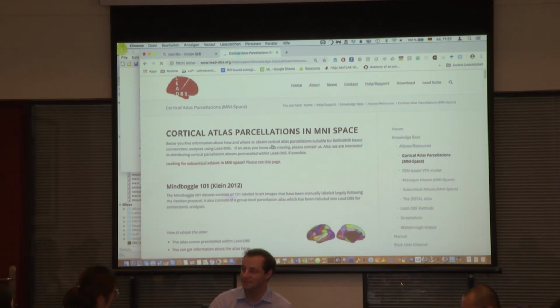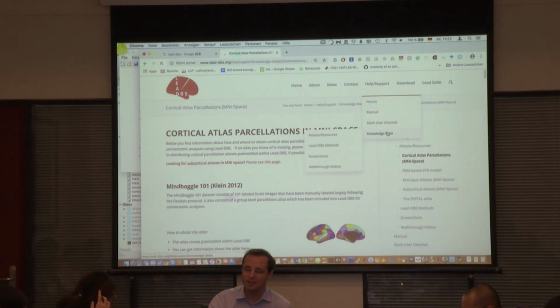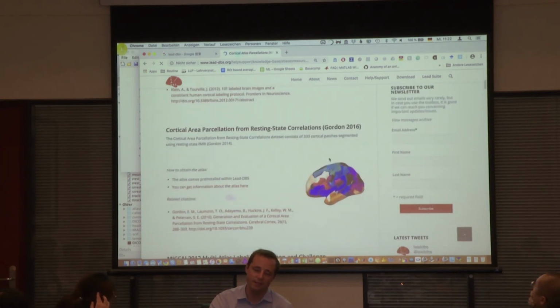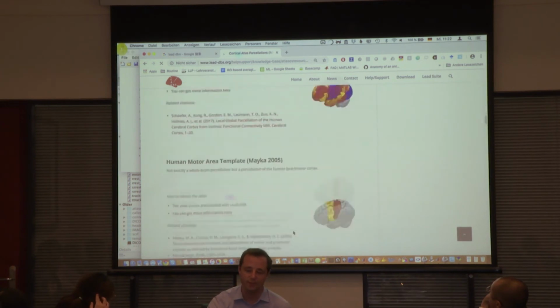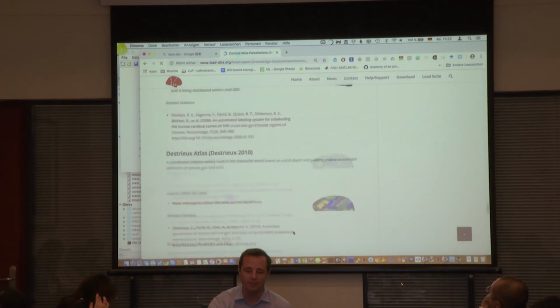Yeah, you can. So maybe these parcellations, as I mentioned in the beginning, look also under Help, Support, Knowledge Base, Atlas Resources, and then Cortical Atlas Parcellations. That's this page. So you will have information about each of these parcellations, how they were made, and where to get more information, or which is the paper to cite if you use them, or to read about them. Right, so there are quite some different options that you can use.